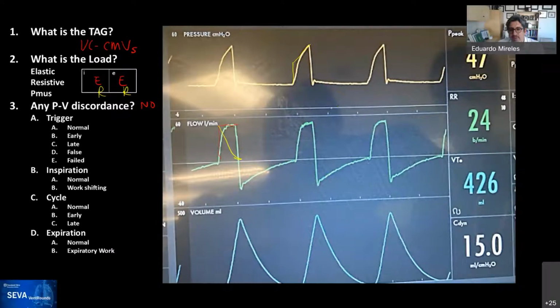So yeah, it can be both at the same time. Very good. And then in terms of PV discordance, I agree with you, Udi. I just wanted you to say it. I wanted you to calm down. If there's no patient activity, there can't be any discordance. I mean, there's no discordance. There could be false triggers, but in this case, there's no activity at all.